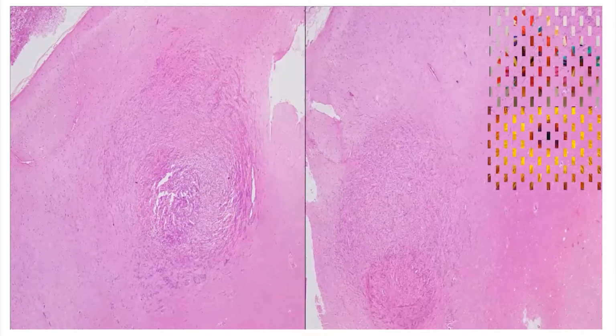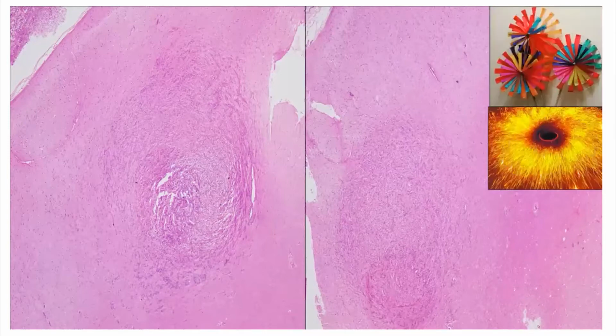So I must turn up the pages. What could this kind of tumor be, showing this typical nodular pattern? While looking at it, I can compare it with a firecracker, with cells arranged around the center in a whirl-like appearance, or the paper fan which we used to play with in our childhood. So this is a childhood age group tumor only, showing a similar kind of pattern.